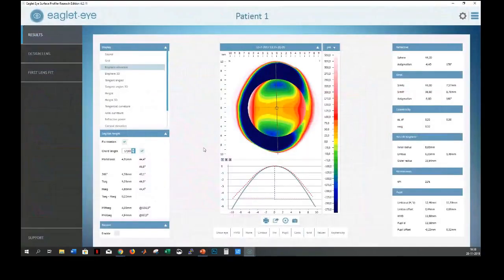And this is my favorite example to show the need for scleral profilometry, so that the measurements we make. What we look at is an extreme scleral example. It is toricity with the rule. So what I've been showing here already, you can see this red dotted line, and it's shown in the cross section as well. So that's the flat meridian, as well as the steep meridian, which is the blue line down here.